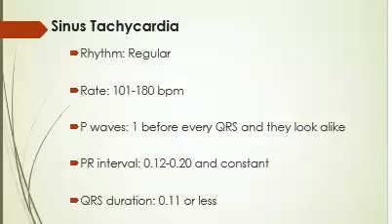Let's move on to sinus tachycardia. Same thing, guys. The only difference here is the patient has a heart rate that is greater than 100. That heart rate can go all the way up, to numbers like 150, 160, 170. So keep that in mind. The higher the number goes, we want to start calling it all kinds of other goofy names.